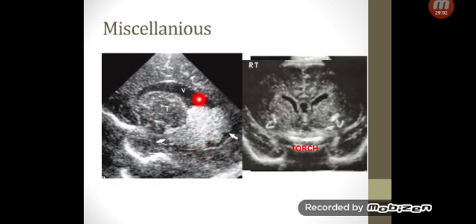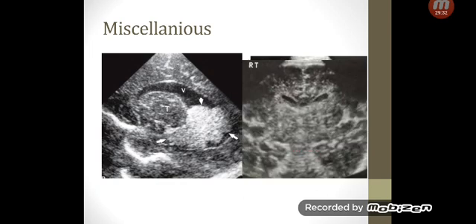This is a choroid plexus tumor that is usually a benign tumor. But I know that this one can be tricky. Some people can perceive that as a hemorrhage, and you usually need a CT to confirm your finding here. But if you see something like that, I know that you're going to go for an urgent scan, which is fine, but at least you can appreciate that one of the potential diagnoses is a benign tumor.